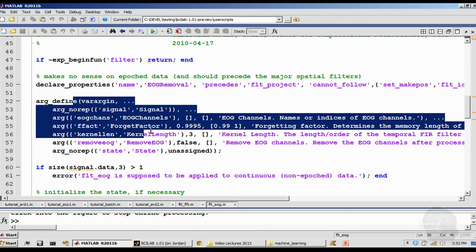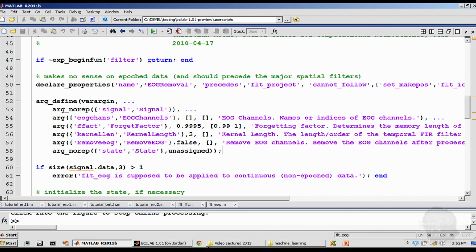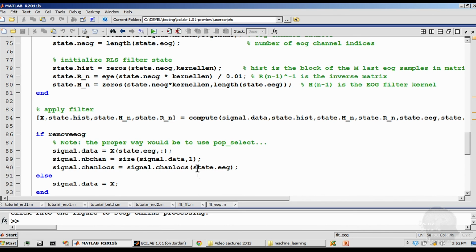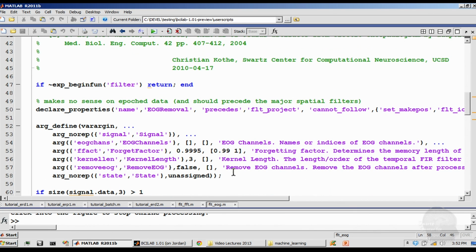With this little specification, you have something that can generate dialogues and that can generate stuff that's somewhere hidden in the GUI. And so for this reason, you never, ever build GUIs in this toolbox. But people get GUIs for free. And that's really important if you just want to write the math and someone else just wants to use a GUI. That's sort of two worlds colliding. But here, you can easily bridge that.